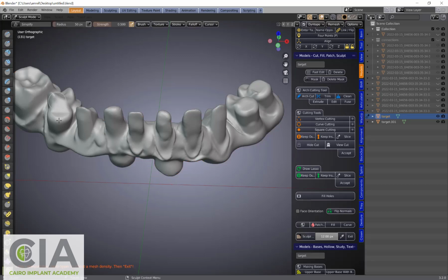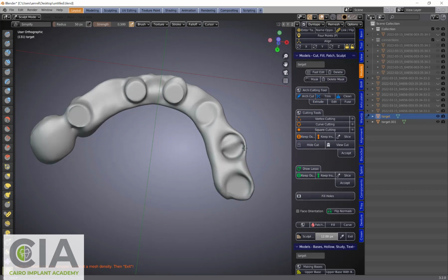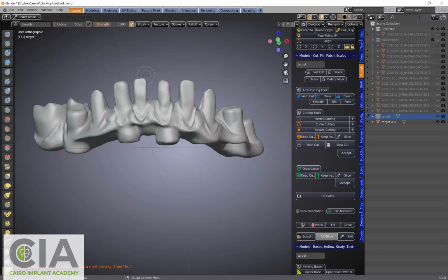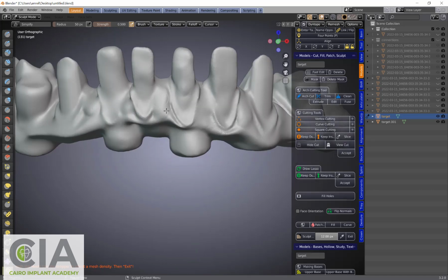I'm not willing to do a lot of modification because this is the design they want to do, so because this is not my design, I will not do too much changes. I'm just rounding things up a little bit so that it can be milled properly.